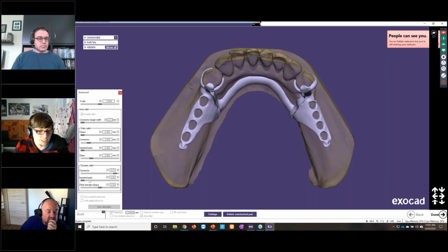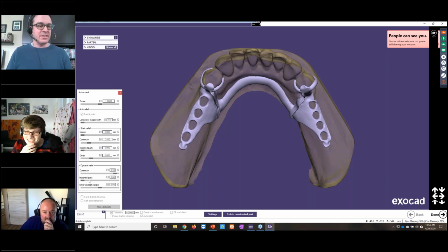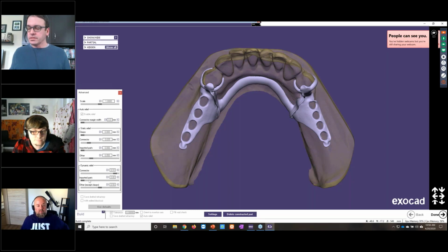Oh, sorry, I didn't pay that close attention. I was answering other questions. The question, oh, sorry, I was just asking if you knew the difference between the static and dynamic relief, how that setting differs between those two there.